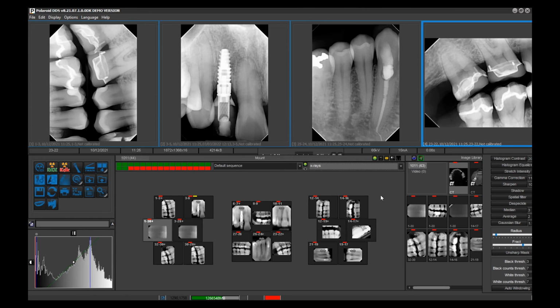You'll see the latest intraoral camera images. You'll see all the X-rays, and if you wanted to see a bite wing series, you would just click on the 4 images, bring them up top, and you can view those separately. You can have a combination of X-rays and intraoral images up here, which is very nice because we can read the X-rays, but patients don't see the grossness of the tooth that the intraoral picture shows. There you go. Exactly.